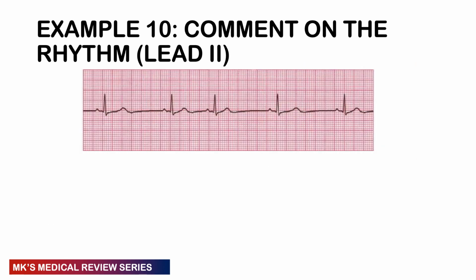We come now to this one. I want you to comment on the rhythm and the rate, if you can. Okay, I hope you have your answer.